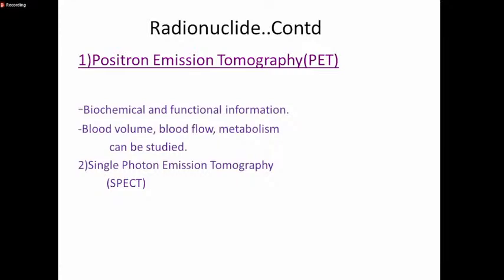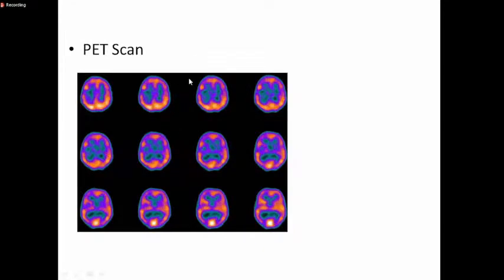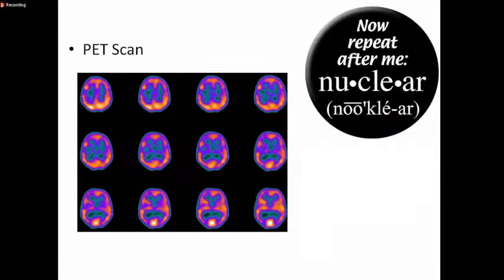This technique is really also biochemical. And what you can produce today is like this. This kind of image, you're able to produce images like this using radionuclides. Same thing here. This is a PET CT showing you activity within the brain. So this patient has been injected with some radionuclide, and this is the normal brain.